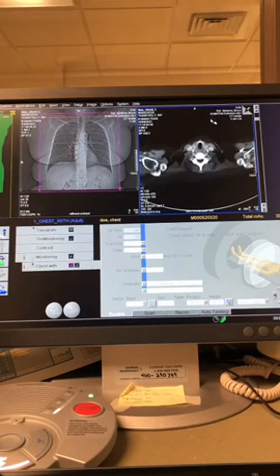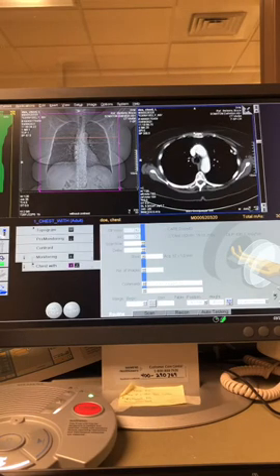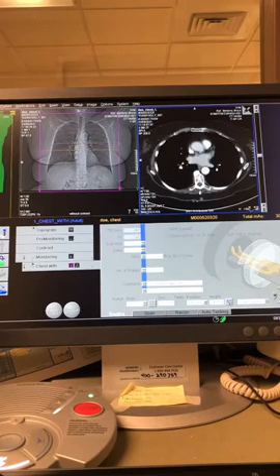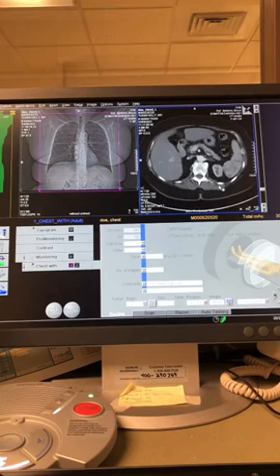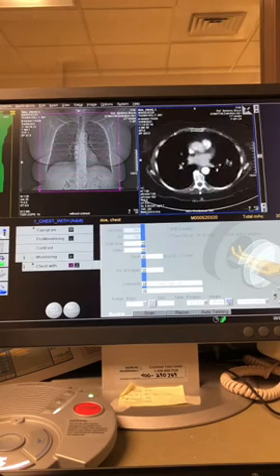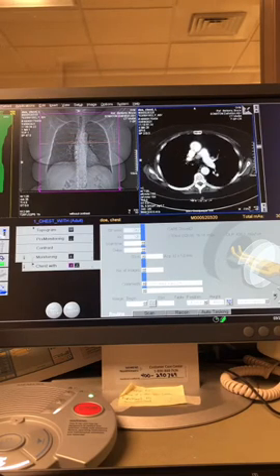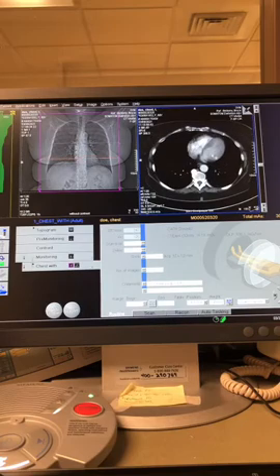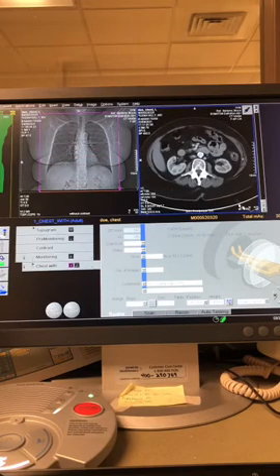All right, so then this is what we get. So we start scrolling through and we can see a beautiful chest CT. All right, now you guys are going to need to be able to identify all of this anatomy. And I know that's what you're going to be doing this week, this first week of this section, is creating these and labeling these and all that jazz. So you'll want to know all these. Every vessel in here is up for grabs. Every portion of the heart, the ventricles, right, the left and right, and all that jazz. You need to know it, and then even once you get down into here, okay?